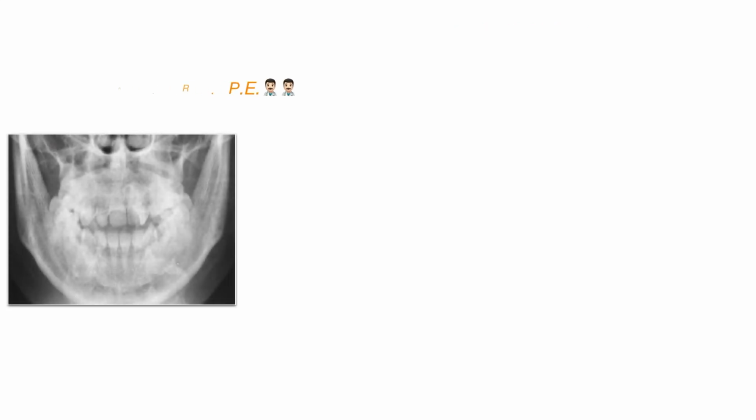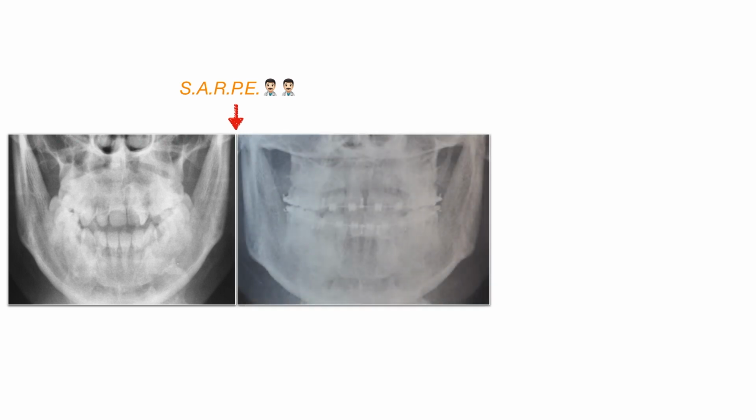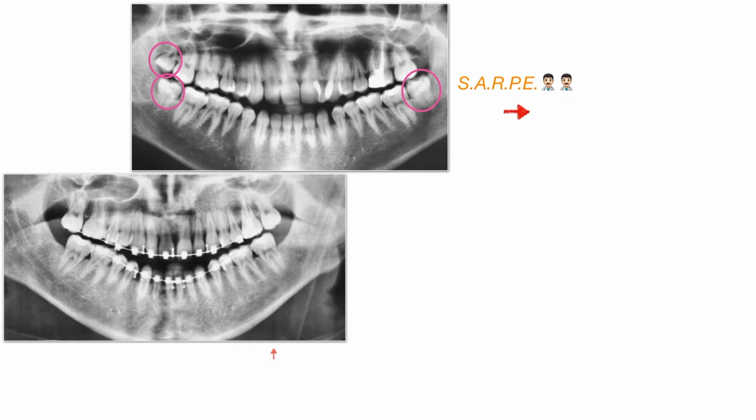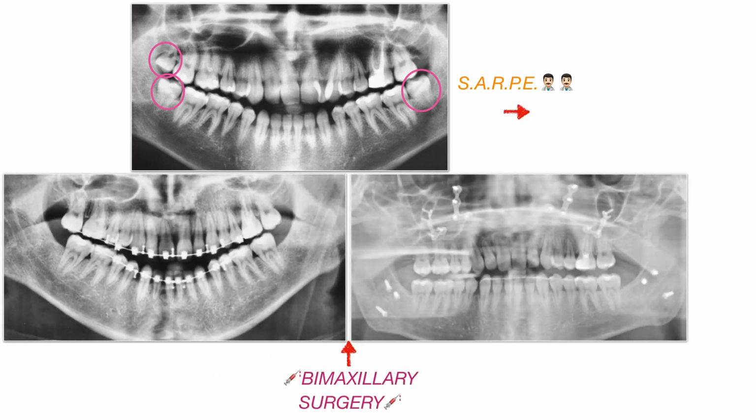Same here. You can now see in the second radiograph the changes in the transversal diameters of the maxilla after the surgical expansion, but there is no difference between the second and the third radiograph, as sagittal changes are not highlighted with this radiograph. And here we have the pre-treatment panoramic with 3 wisdom teeth. They have been removed in order to get the right fracture line during the second surgery.